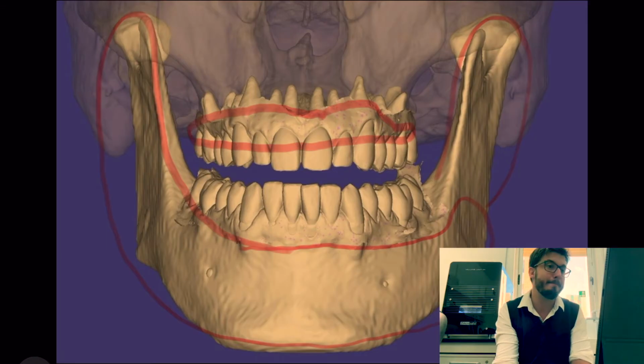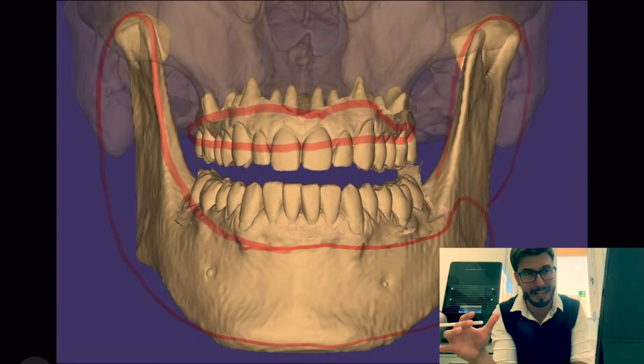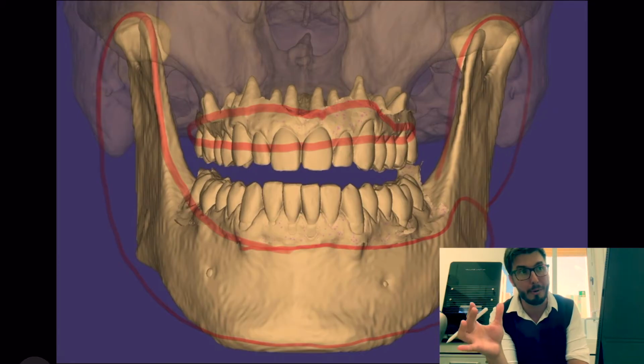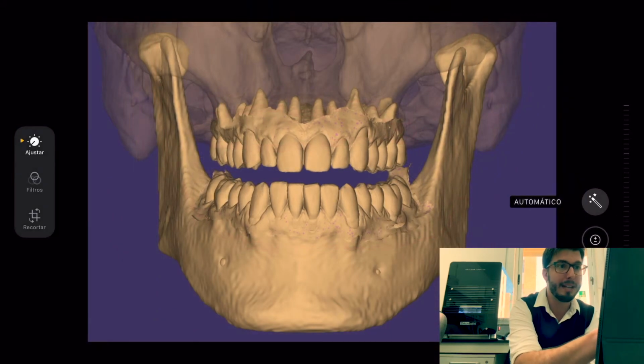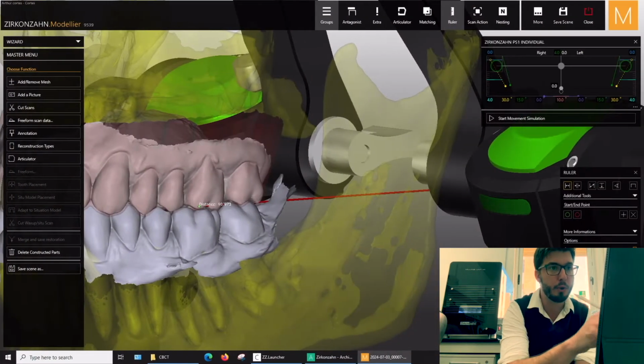Of course that depends. You only have CBCT if bone information is needed, so for surgical planning and those things. That's not really the case today. You don't need a CBCT to do occlusal splints or bite splints. All right, so let's go back here now to our procedure.